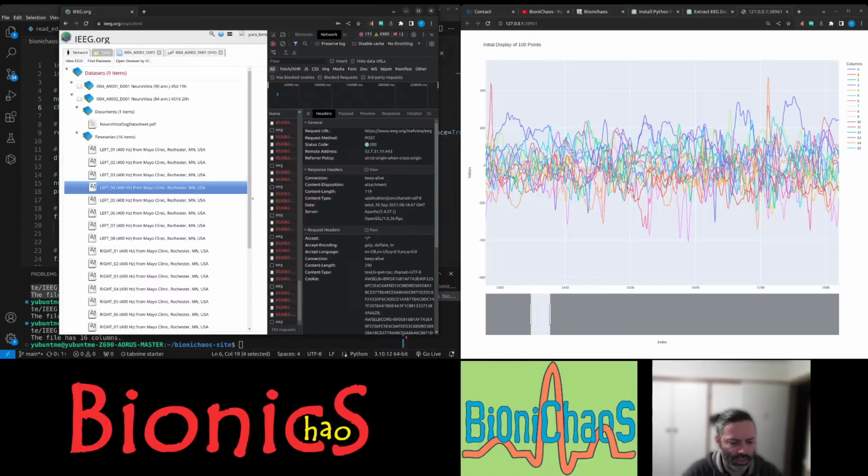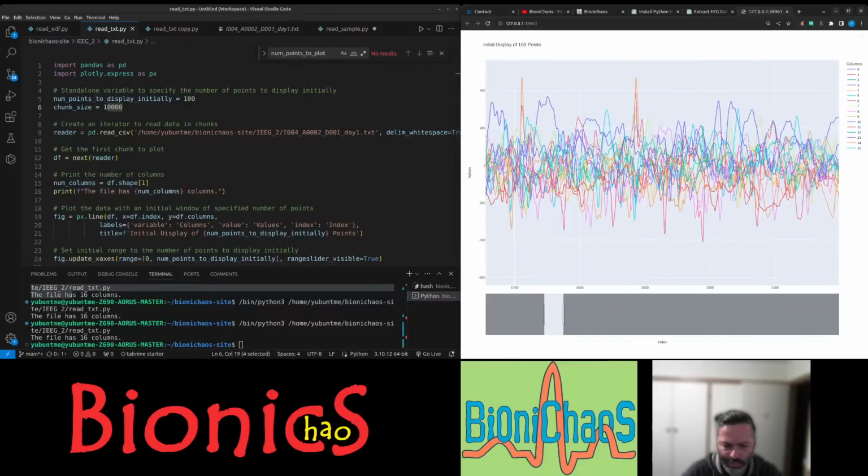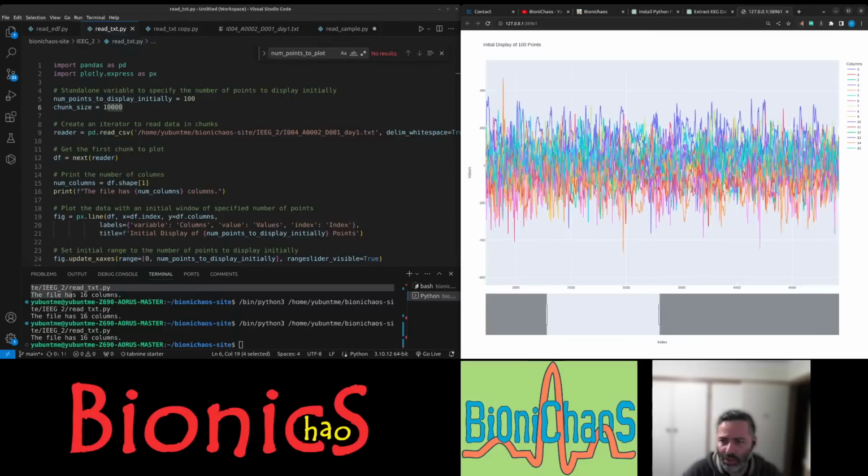And the other thing is, just pop it on our screen to see when it quite finishes loading. Still loading. We have this data open here as well.